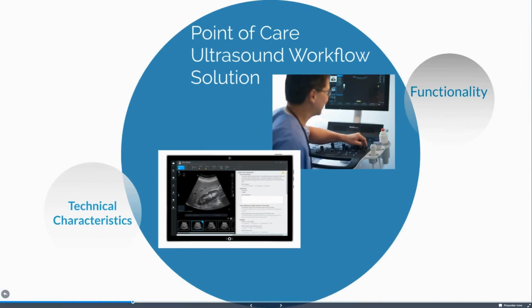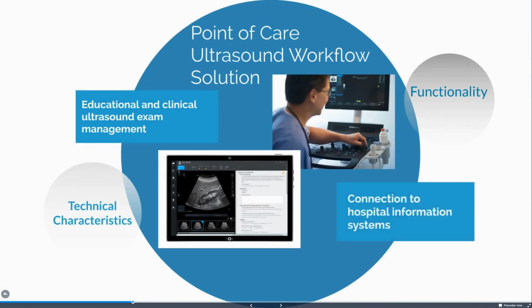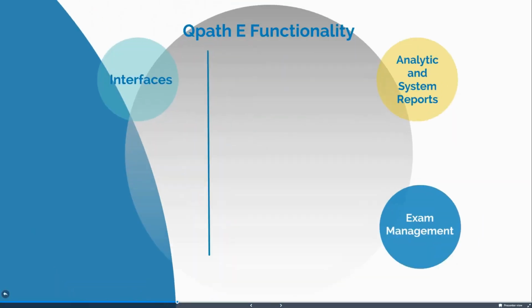Qpath E offers a solution for the seamless point-of-care ultrasound workflow which can be customized to meet specific needs for educational or clinical purposes. Our application is a smart, flexible and user-friendly tool to perform, document, review and bill ultrasound exams, all in one place.